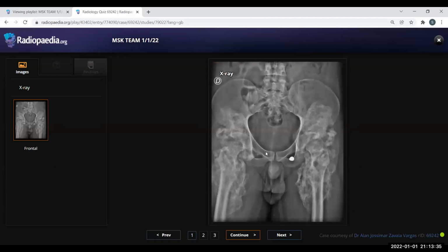Okay. I have an anterior posterior view of the pelvis with both hip joints. Here I can see bilateral symmetrical lobulated areas of dense mineralization projecting over the hip joint and the lower half of the pelvis and extending into the thigh region. So if the patient had a paralysis or a spinal insult, this could represent heterotopic ossification.